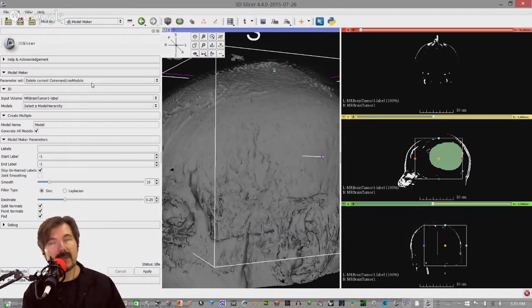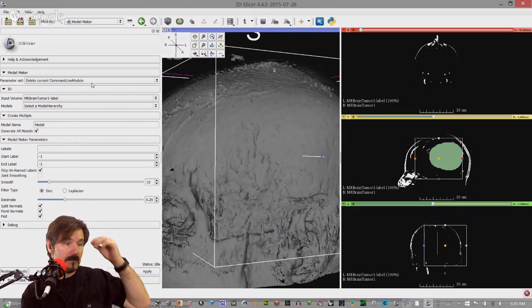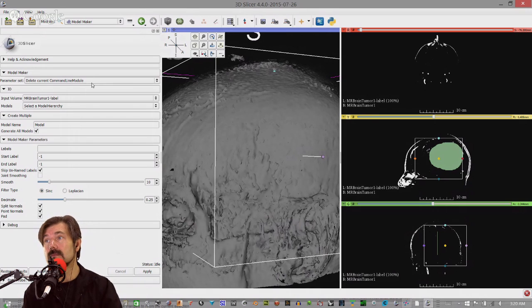And Mike, let me just ask you, in the model that you're cleaning up right now, I assume that when people make these STLs, they may not just want to print them, but they'll also want to, let's say, post them online to share. My question is, can you then resave the STL from that program cleaned up and then post that one? Oh, yes. In fact, once it's done cleaning up the shells, I can show you how that works. Great. So yes, you can do that, in either this application or Meshmixer.